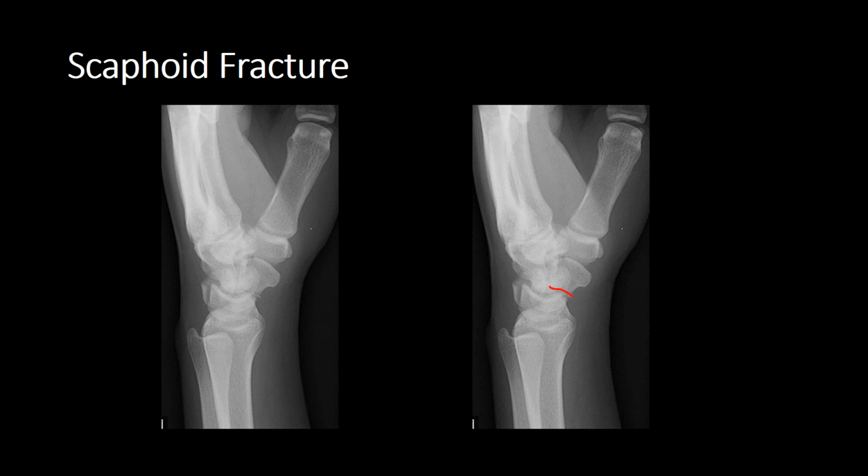Most hospital policies are to do 4 views for scaphoids. Scaphoids are notorious for the fractures not being visualised on first presentation, which is why patients are quite often casted and then asked to come back in 10 to 14 days if they're still symptomatic, and that's when they have tenderness in their anatomical snuffbox.